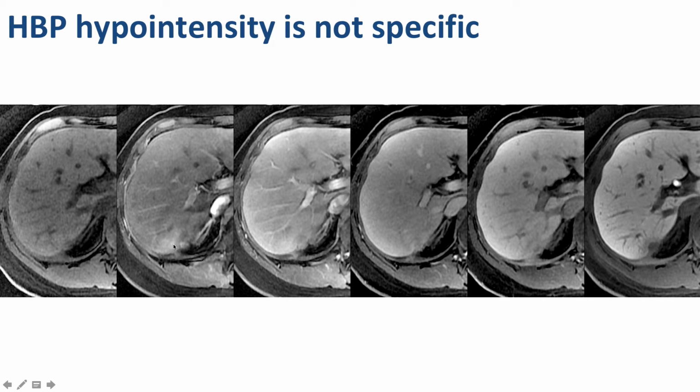And she has this lesion, hyper-enhancing. And look, it's dark in the hepatobiliary phase. So, what would a 45-year-old woman who's been on birth control pills for a long, long time have with low OATP expression? Slam dunk, hepatocellular adenoma. She wanted to get pregnant. The surgeon was worried that this might bleed based on its location, so they did a hepatectomy. Guess what this ended up being?